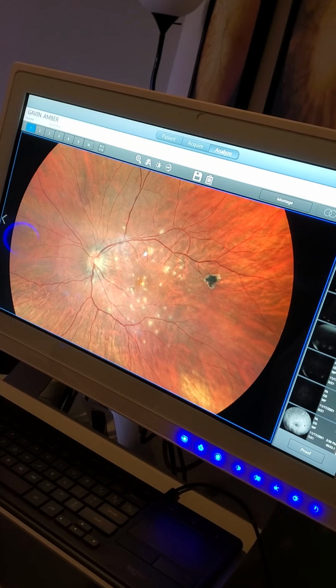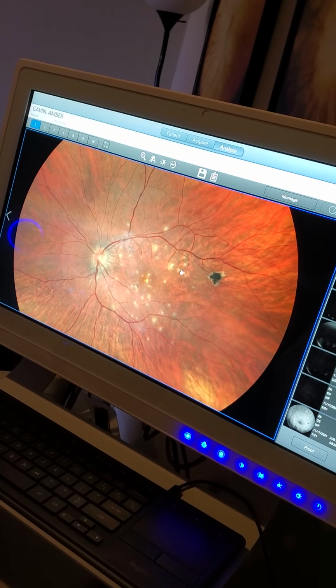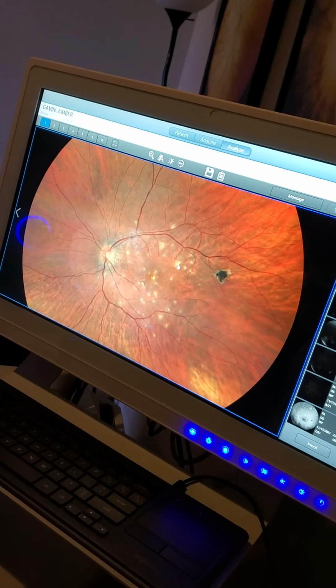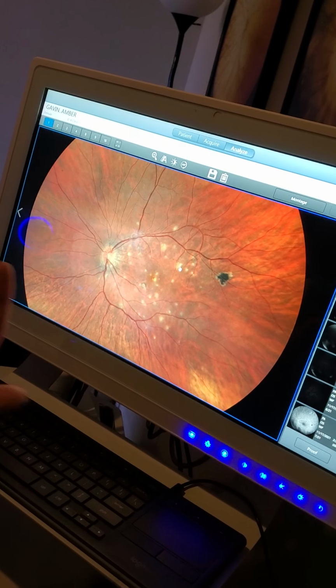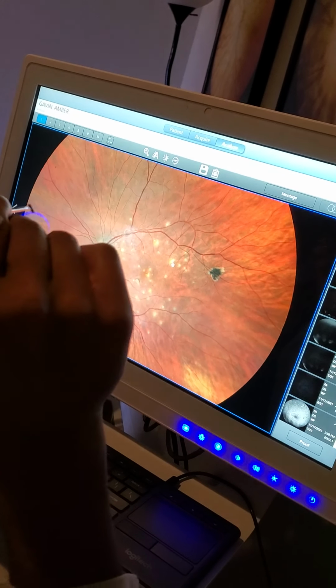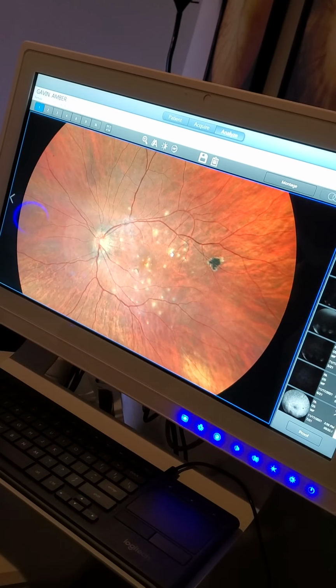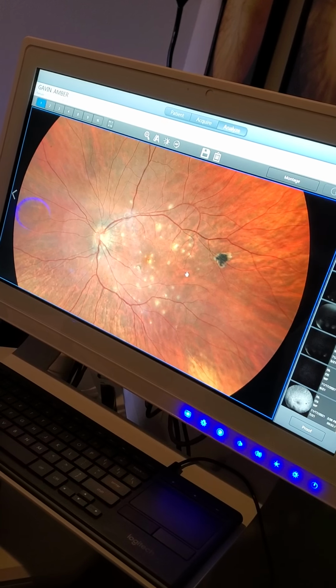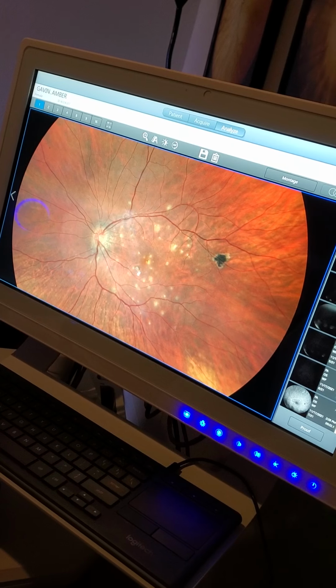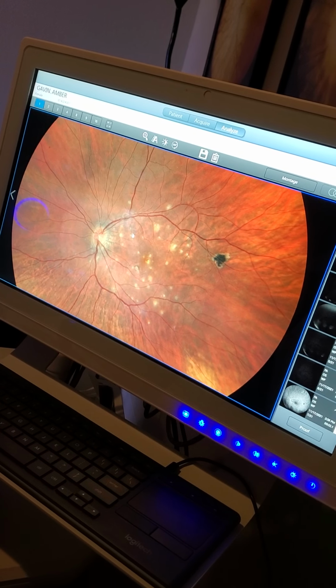So these are dense white little lesions here that are scars. Now, there are all these different layers. It's a 2D picture, so I can't really show you the different layers of the retina in 3D. But the point is, when you have a hole through and through the retina, it looks white. If the hole is not complete, you start seeing some of these black scarring. You see some of it here as well, and you actually have some in these corners here as well.